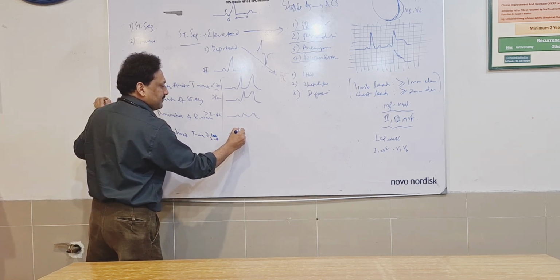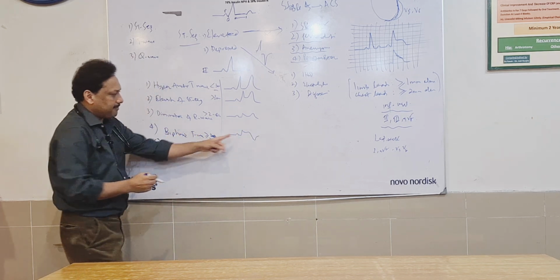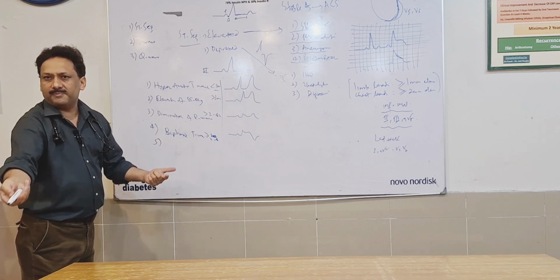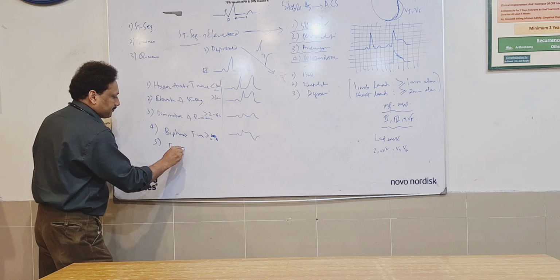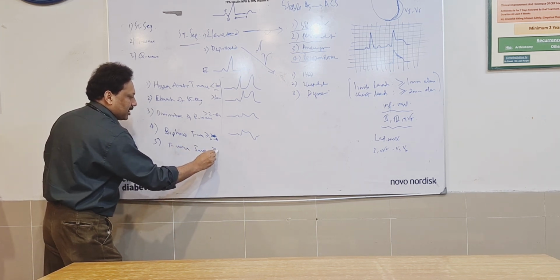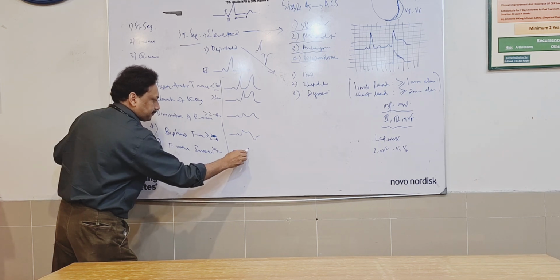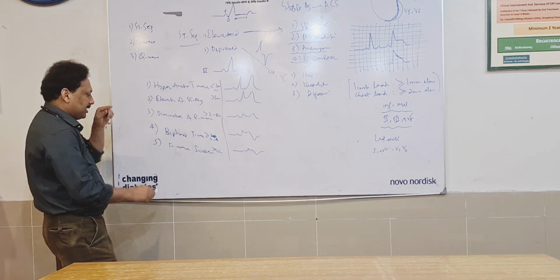What do we understand by the term biphasic? A T wave is there, below the baseline, above the baseline, below the baseline. Then the next stage, after biphasic T wave, a T wave may get inverted altogether. It may not get inverted, but it may. So then T wave inversion, usually greater than 4 hours, you may find T wave inversion. Now the picture would be a small Q wave and then ST segment elevation with that kind of T wave. So that is typical T wave inversion.